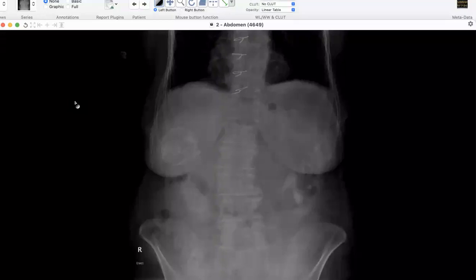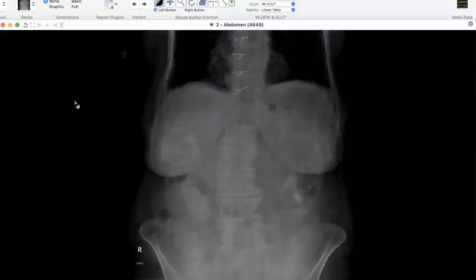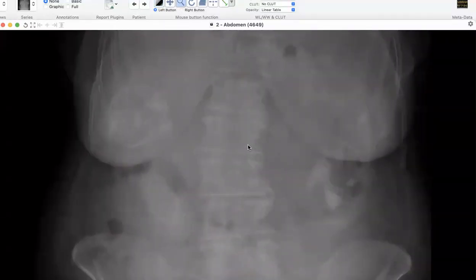Yeah, there are other calcified lesions on the left side also, in the region of the spleen. So in both organs, it could be either hydatid or tuberculosis, granulomatous disease I mean. And I'm looking also beneath the right hypochondrium, beneath the liver, there is another hyperdense lesion. I'm not sure if it is within the track of the right kidney. So there are multiple calcified lesions. Maybe zooming is better. I'm just looking at this area also, because there is some calcification on the right.